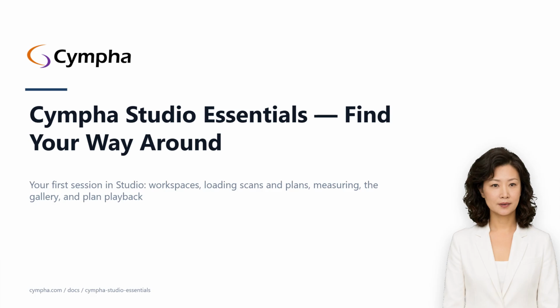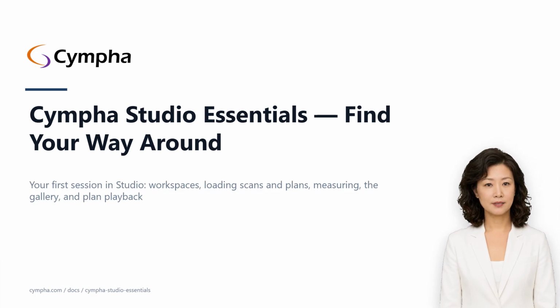There's nothing to install. By the end of this lecture, you'll know what the 7 workspaces are and how to switch between them, how to open a scan or a treatment plan, how to drop a measurement, how the photo gallery works, and how the case bar plays a staged treatment plan back. 10 minutes of orientation that makes every other Studio lecture in this series easier. Follow along at Cympha.com or listen now and read later.